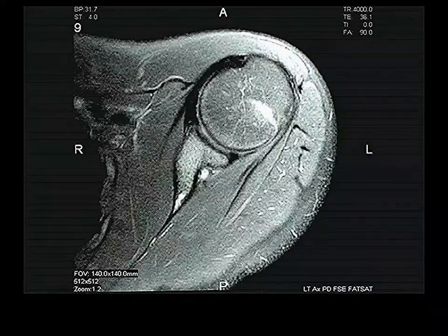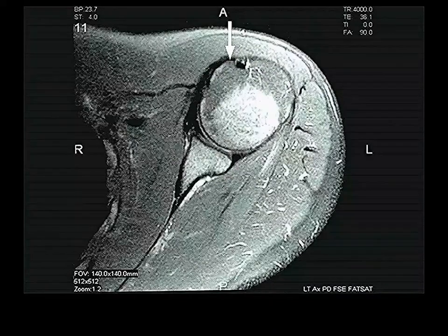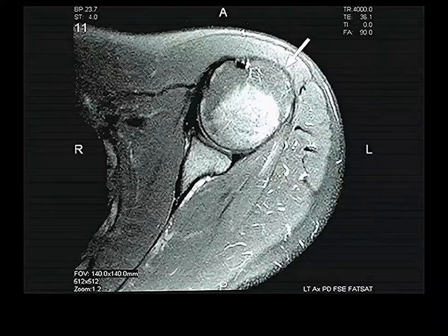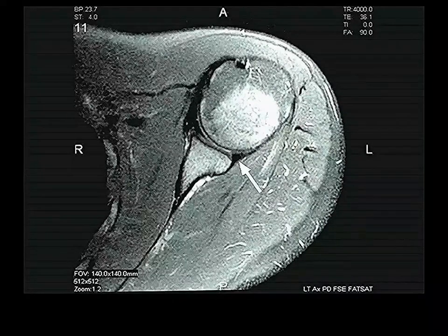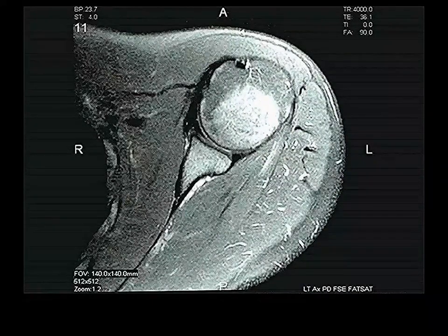Keep on going further and further inferiorly, and we now start to see a lesser tubercle of the humerus and the greater tubercle of the humerus come into view. Head of humerus. Glenoid. This little thing here is part of the glenoid labrum, which you'll see on the last day of class. You'll see this thing called the labrum.